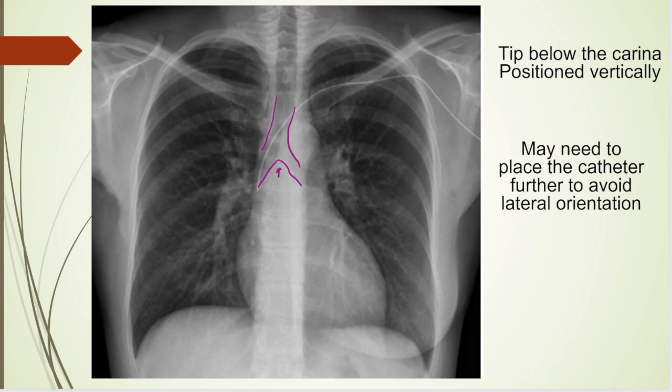You look at the bones, bones are all okay. C, cardiac silhouette, that looks fine. D, your diaphragms, look fine. Then E for everything else. Look on the patient's right side. Looks like you get good vascular markings. Patient's left side, good vascular markings. So you know you don't have a pneumothorax over there.